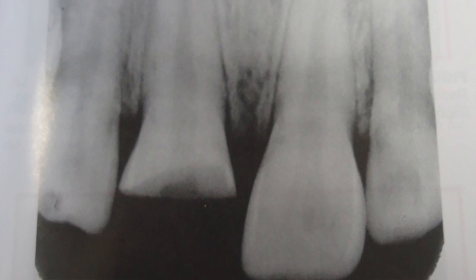Well, a fracture refers to a piece that's broken or broken off. So coronal fractures are the easiest to identify clinically because you can actually see where the top of the tooth has been broken off. In a radiograph, it just looks like part of the crown is missing. And what dentists will do is they'll take these radiographs in order to assess the damage to the pulp chamber.